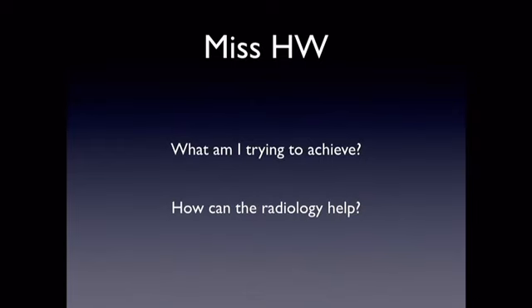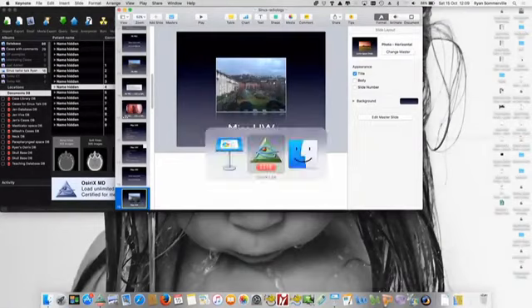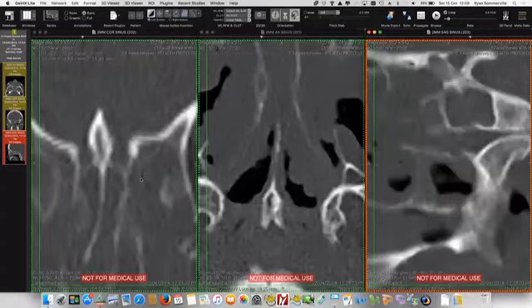And the first time I went in there, I didn't appreciate that. She was on steroids, none of the other stuff, and I bailed halfway through the operation because it was just bleeding, hemorrhagic bleeding, I had to stop. Couldn't see anything. So if we look at her scans, similarly again, we're going to try and find what the most important part of her imaging is.